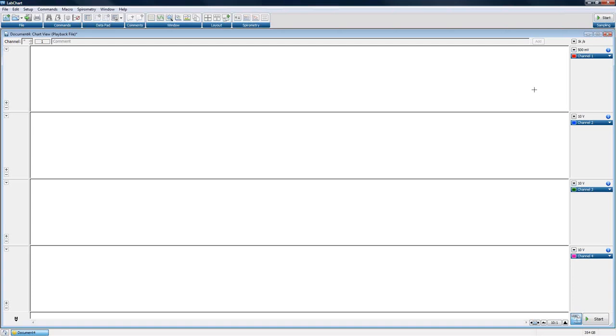Once we've talked about the flow head orientation, we're going to talk about setting up the flow channel. As I said, my spirometer is connected here to the flow channel in channel 1, and we're going to go ahead and record a simple flow calibration here. A word on calibrations.